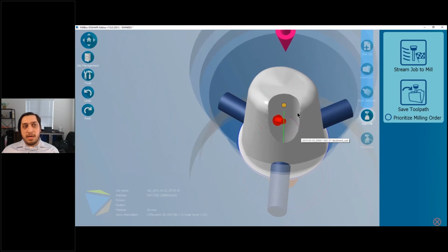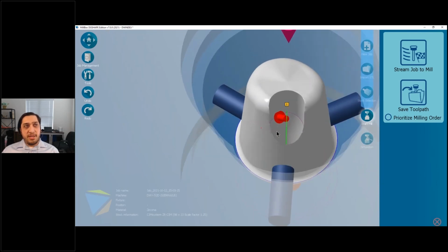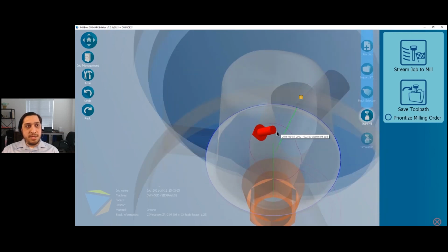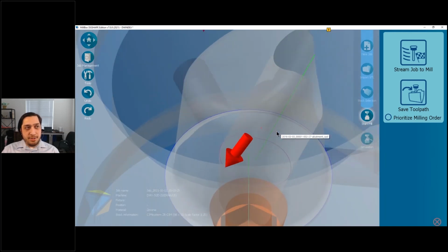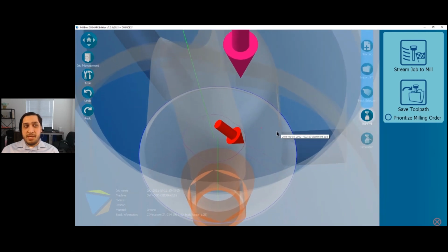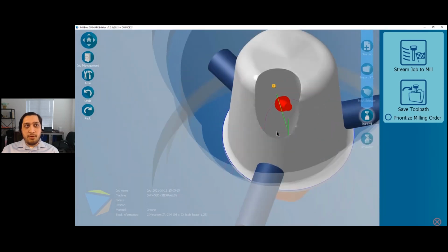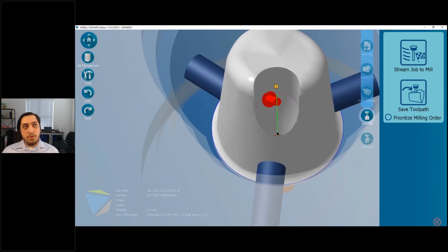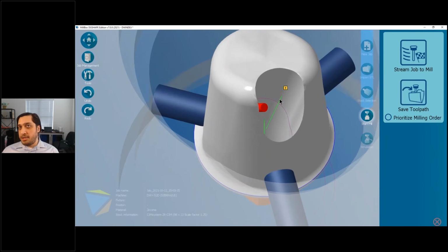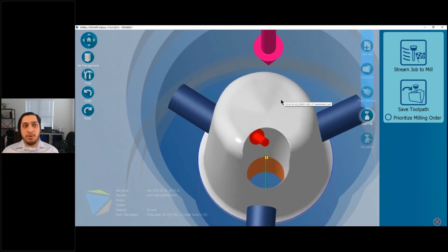So in our particular example here, the software has found an issue, and not only has it found the issue, but it's actually showing us where that issue is. Now, in some cases, these issues we may not be able to see with our naked eye. That means that there could be an obstruction to the borehole. There could be that the mesh or the data in the mesh is inconsistent, and so it throws the CAM for a loop. But the easiest way to tell what's going on with the case is first you want to look at the borehole.